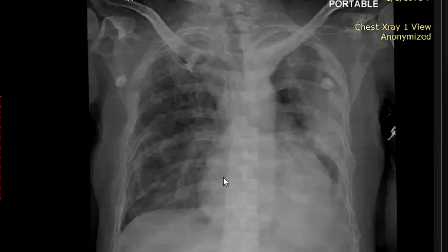However, in the ribs at the lateral end within the opacity, I can appreciate a break; maybe it's superimposed or projectional, or there are some lines passing through the lateral end of the ribs. However, I cannot appreciate that this opacity is progressing further into the lateral chest wall. The soft tissues appear normal.